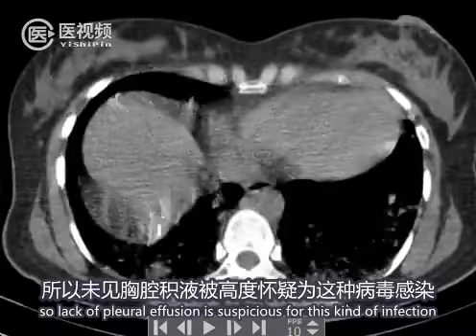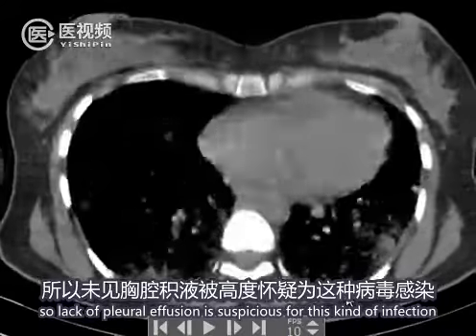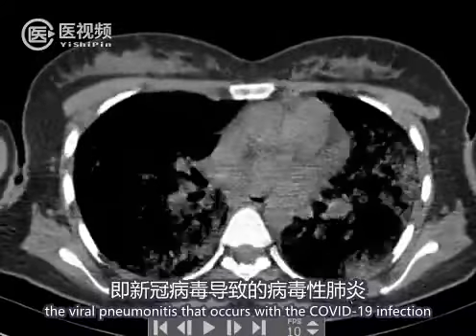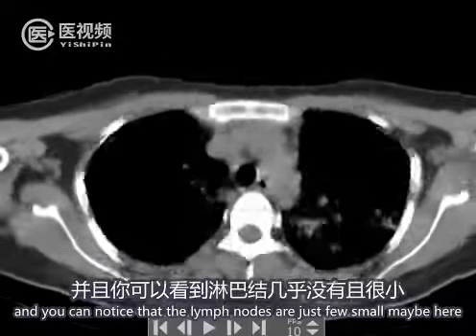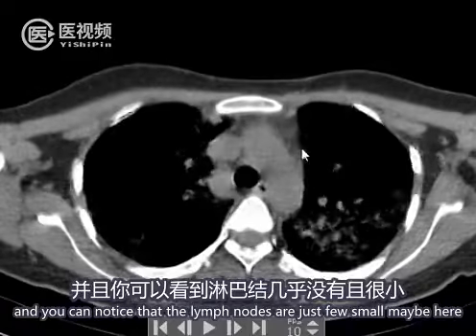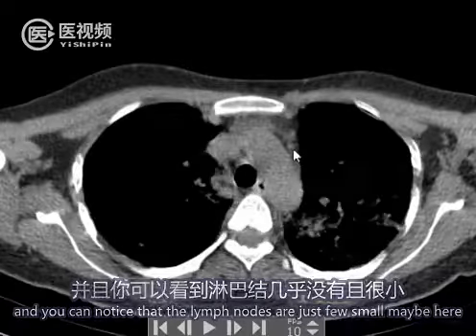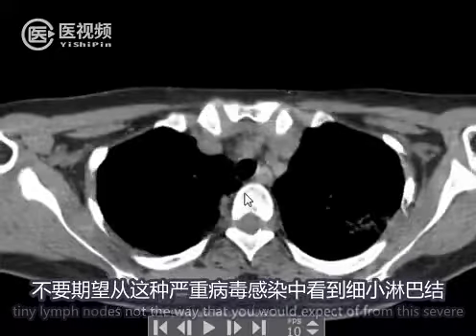So the lack of pleural effusion is suspicious for this kind of infection, the viral pneumonitis that occurs with COVID-19 infection. And you can notice that the lymph nodes are just a few small, tiny lymph nodes, maybe here, not the way you would expect from this severe infection.